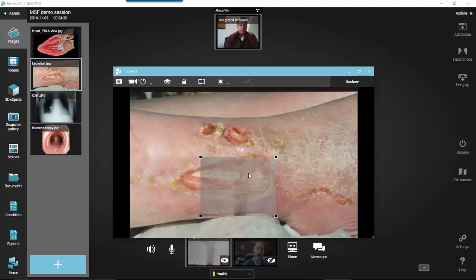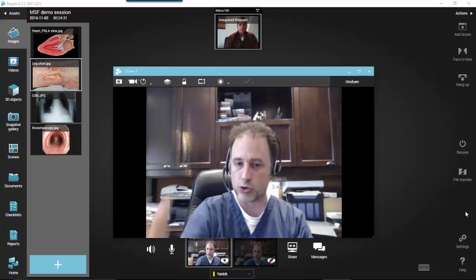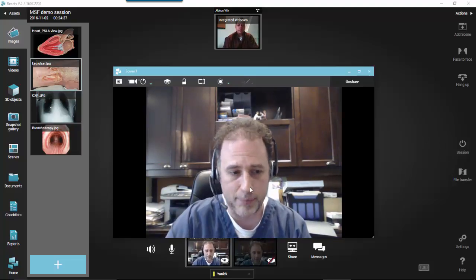It just shows you how you can use these different functionality in a very easy way. Here I'm showing you a lot of different things, but in fact it's always the same. Drag and drop. You can play with it, change opacity, change size, so it becomes very, very simple.